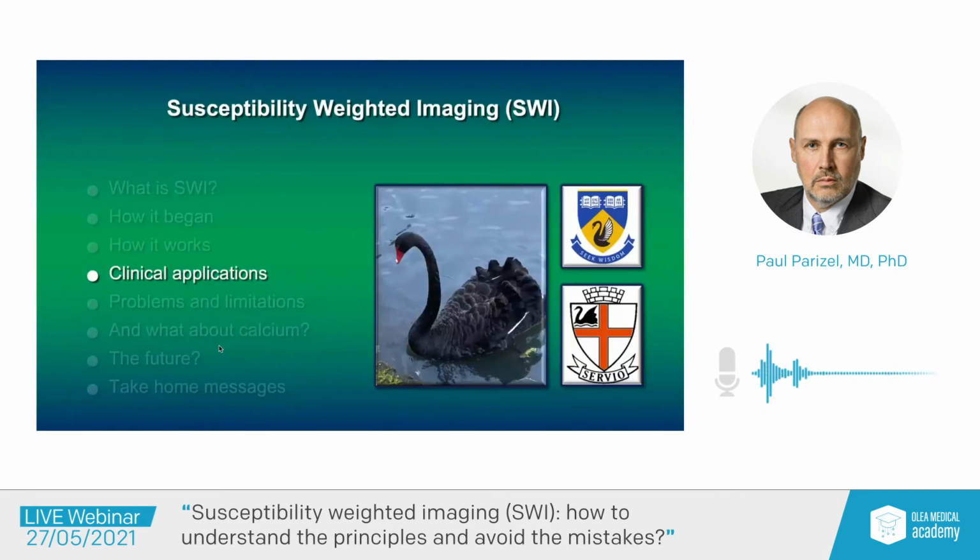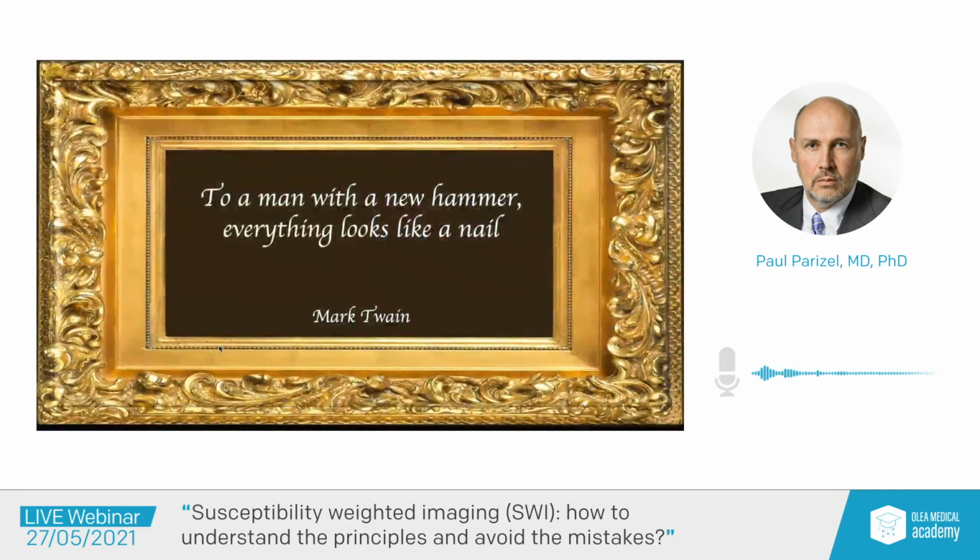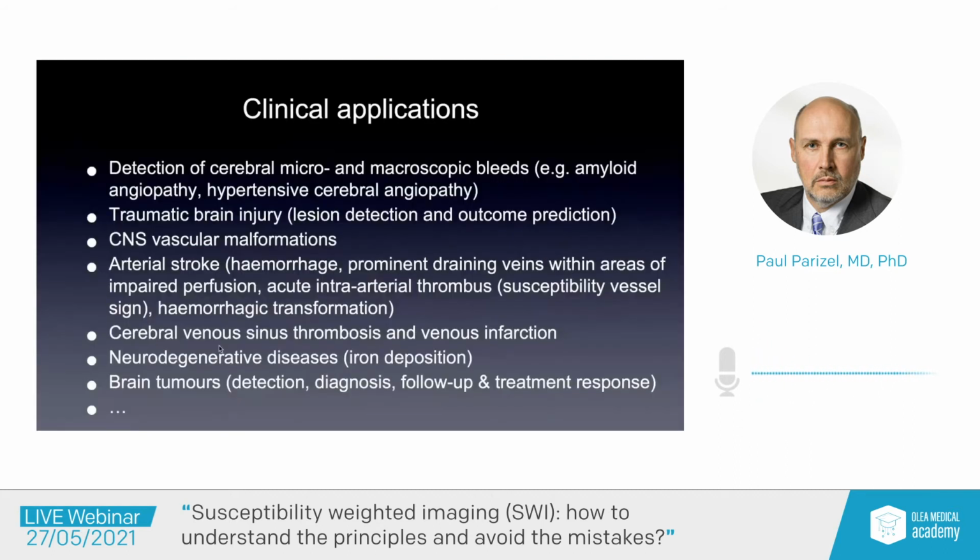Let's now look at a few clinical applications. And I would like to start with one of my favorite quotes from Mark Twain: "To a man with a new hammer, everything looks like a nail." And that's what we've seen happening in the past 15 years with susceptibility weighted imaging. People have been using that sequence for just about everything.